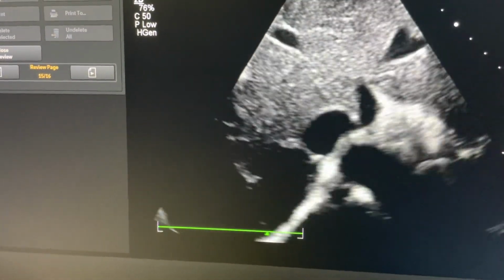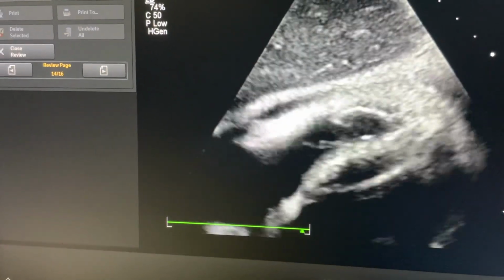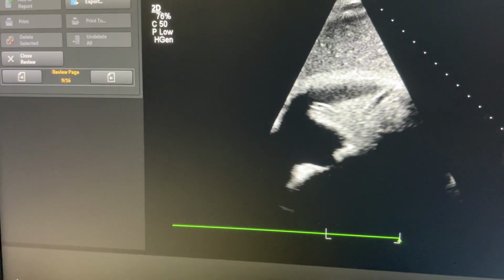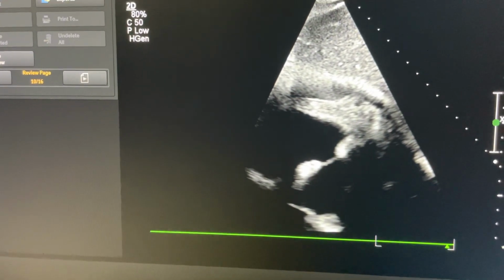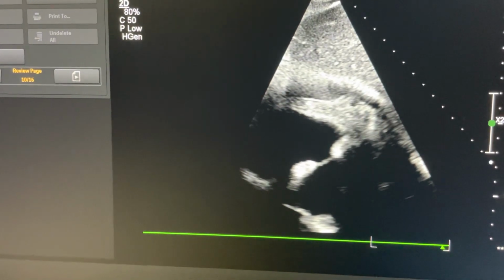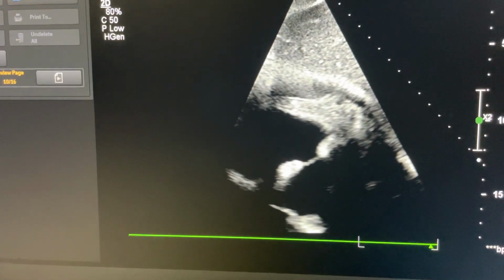So this is isolated right ventricular myocardial infarction, and this is dumbbell shaped hypertrophy of interatrial septum, lipomatous hypertrophy of interatrial septum. This benign finding does not carry any significance, only it is usually seen in obese patients.